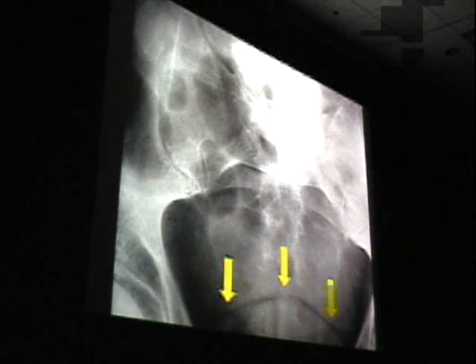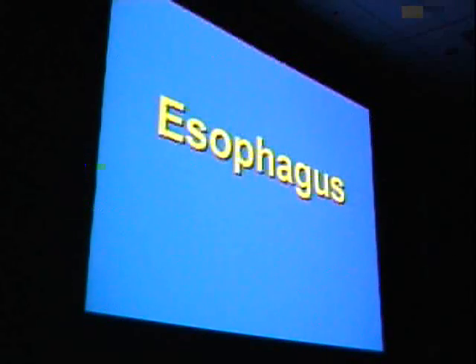Here's somebody with increased density in the abdomen. Notice that there are no normal soft tissue planes above. The spleen's a little bit prominent, but more importantly, look here. Here is paravesical fat in the pelvis. Everything above that can't be bladder. And if you look and see it's filling the pelvic recesses, this is indicative of ascites. And this patient actually had a ruptured spleen, and that was blood. Everything below that has to be bladder. Okay, and so that's a very important finding for us in terms of making the diagnosis of ascites. And obviously in trauma, it's a good marker for blood.